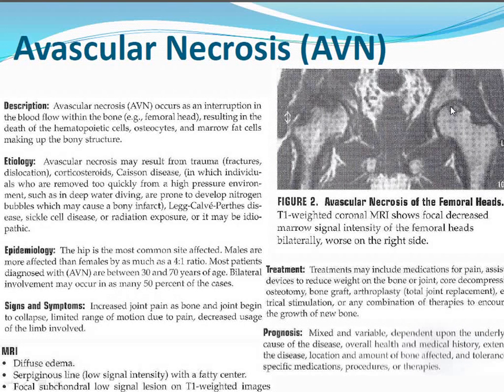On this one, there's a little bit of a similar finding on the other side, but it's definitely more obvious on this side. So yeah, sometimes they'll just have to end up going right on to hip replacement depending on how bad it is.